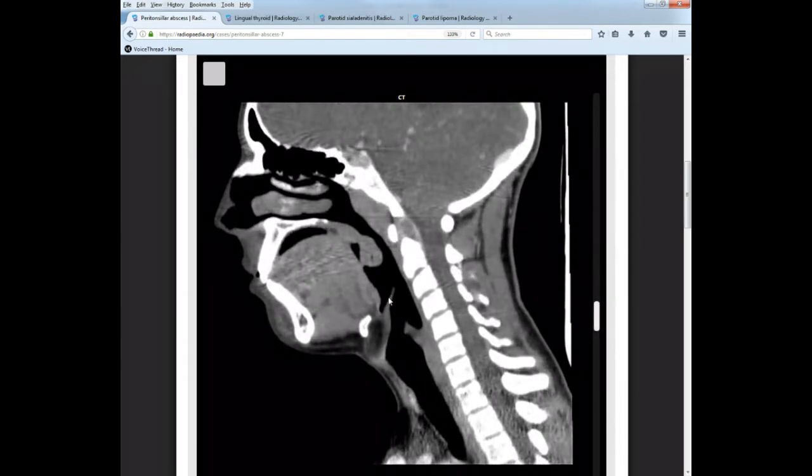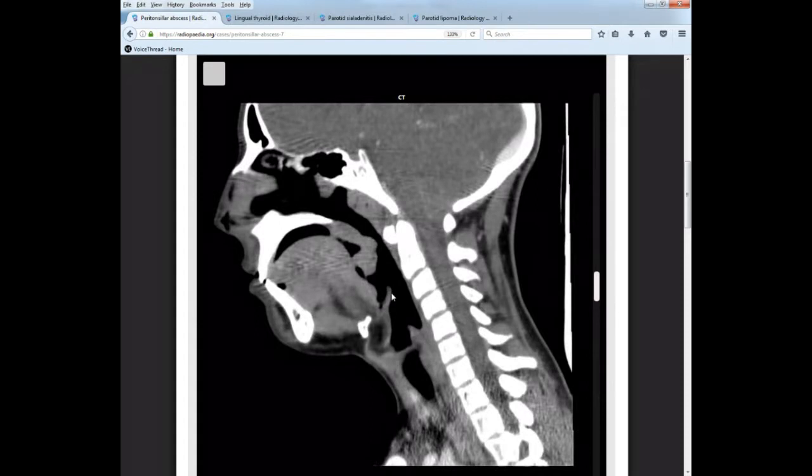This pouch right here, just anterior to the epiglottis. Okay, remember the epiglottis during swallowing folds back this way. So it'll fold right down, close over the opening of the trachea, and allow food to go right down the oropharynx, down into the esophagus, posterior to the trachea.